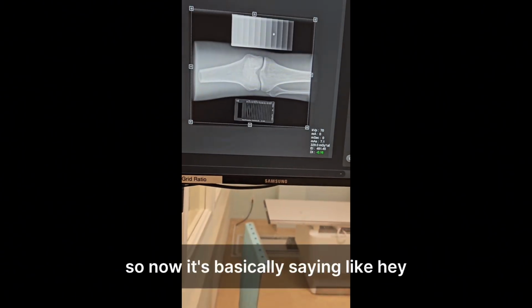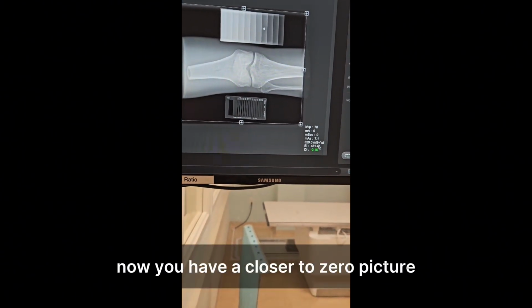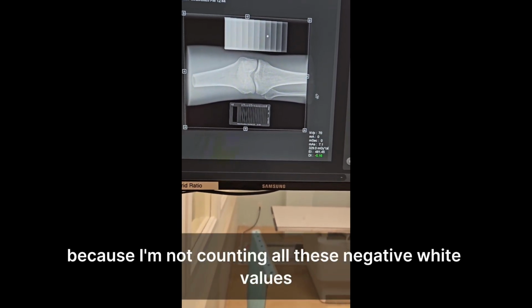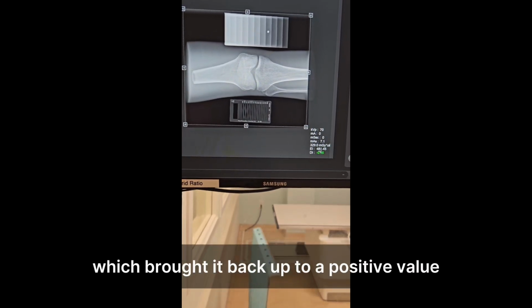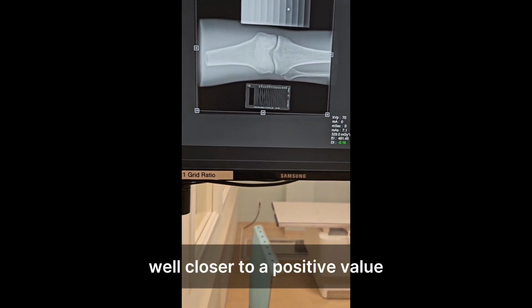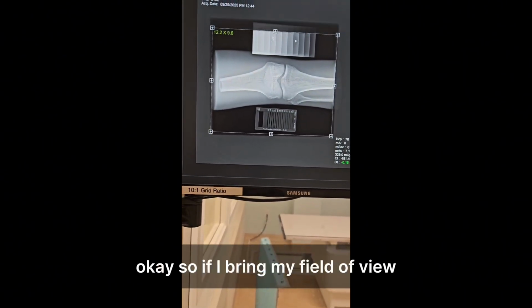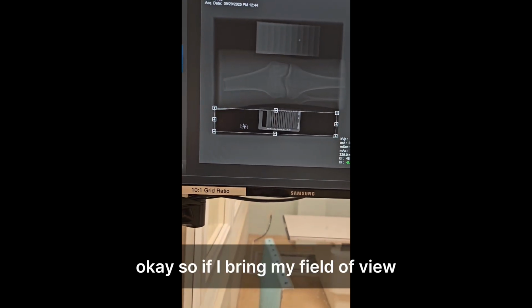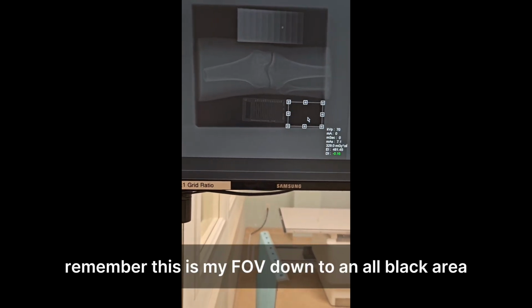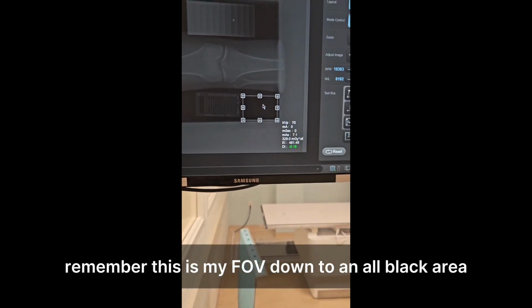So now it's basically saying, hey, now you have a closer to zero picture because I'm not counting all these negative white values, which brought it back up to a positive value. Well, closer to a positive value. Watch this magic though, okay? So if I bring my field of view, remember this is my FOV, down to an all black area, okay?